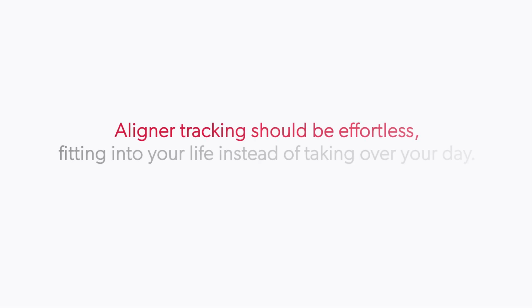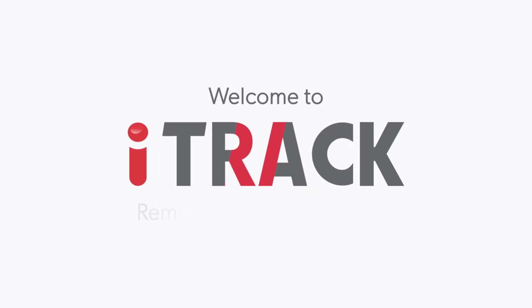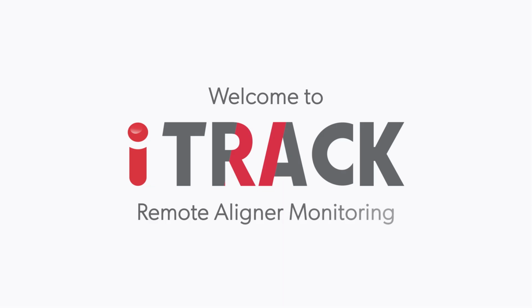Aligner tracking should be effortless, fitting into your life instead of taking over your day. Welcome to iTrack, an AI-powered remote aligner tracking feature that keeps aligners' progress monitored and on track.